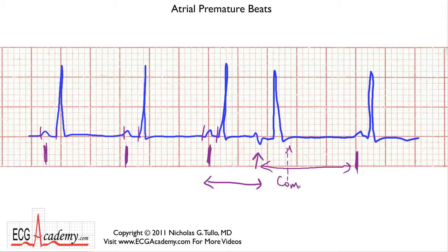And the next sinus nodal beat occurs fairly well on time, resulting in what's referred to as a compensatory pause. Now, it's interesting because many patients will complain about the pauses feeling like their heart stopped for a split second, rather than actually feeling that extra heartbeat. So with a typical atrial premature beat, it's going to be early, the P wave's going to look funny.